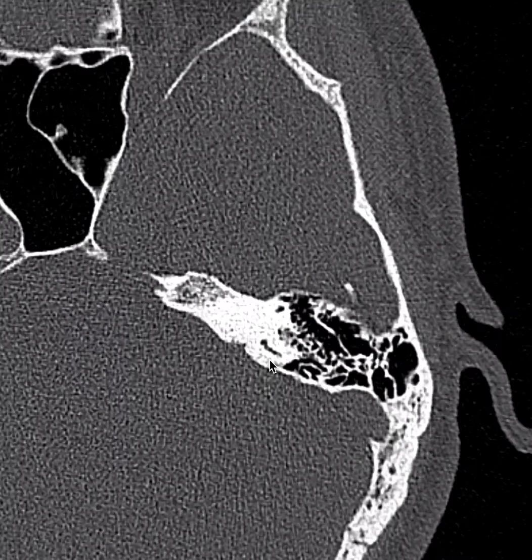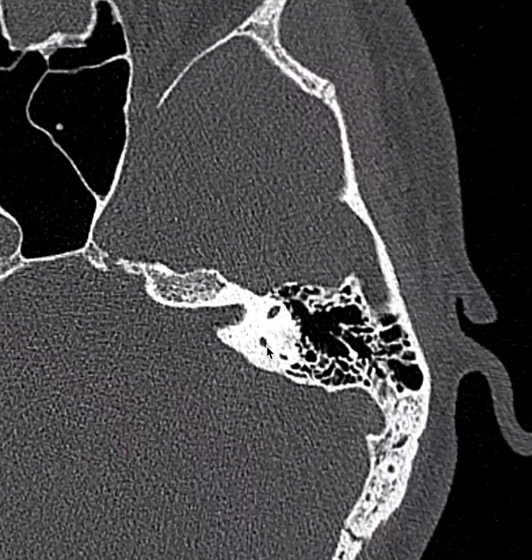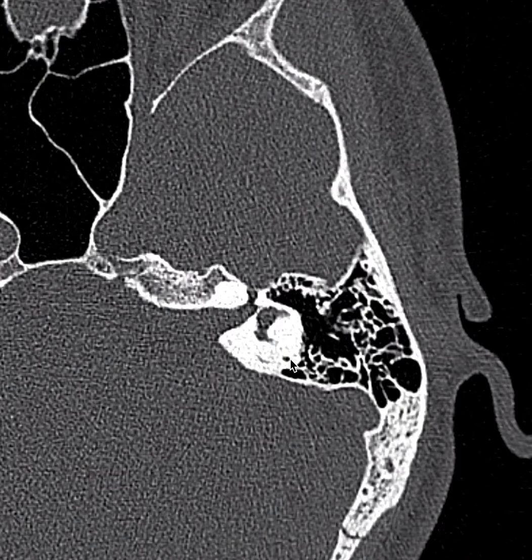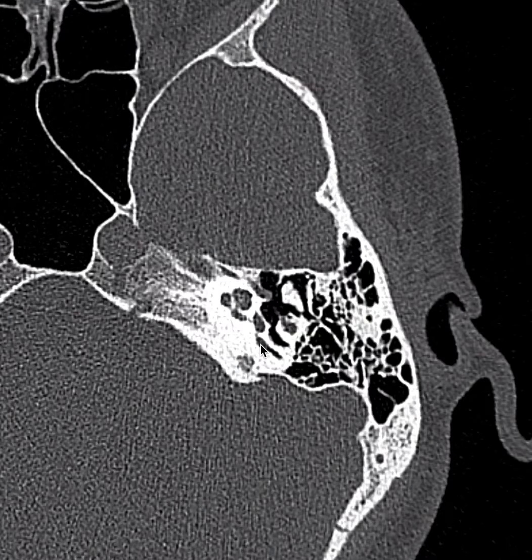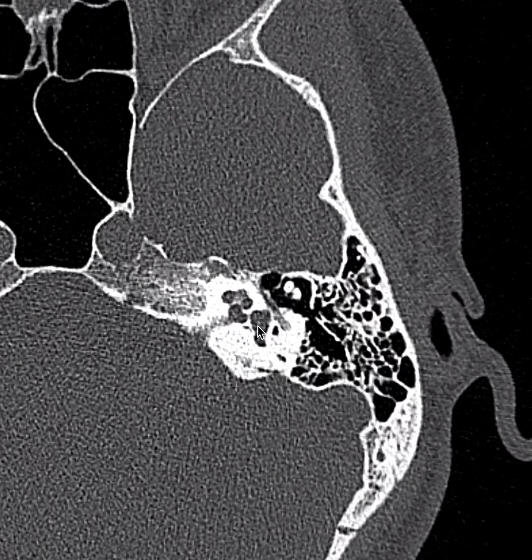Scrolling further inferiorly, we're going to see the posterior semicircular canal converge with the posterior limb of our superior semicircular canal. Below this point, it's therefore called the common crus, and here we see the common crus coming down into the vestibule right here. Watching our posterior semicircular canal, we'll watch it get a little more inferior than the others and come down this way and then head anteriorly and back superiorly. So now I'm going to scroll superior a couple slices and see it get back to the vestibule.